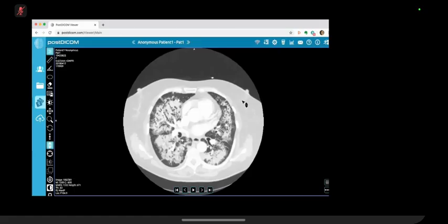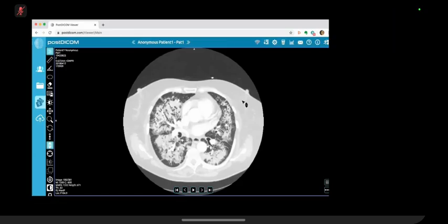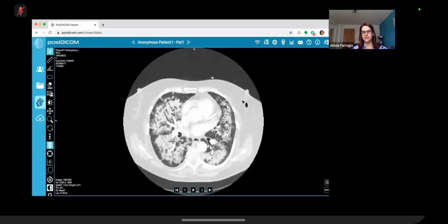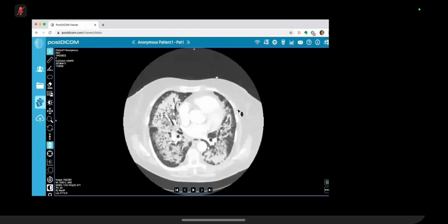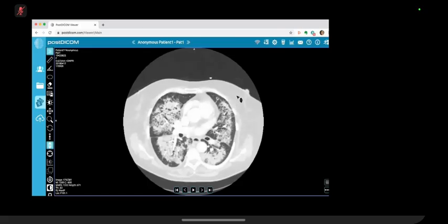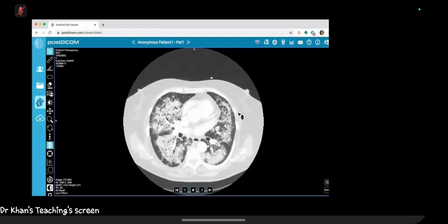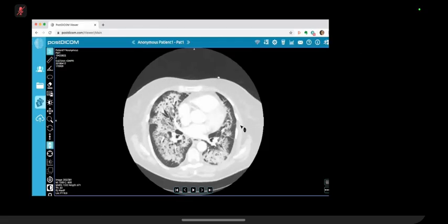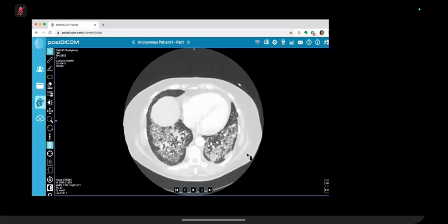Pulmonary alveolar proteinosis can sometimes give this appearance as well. It can spare the subpleural spaces. Yes, but usually it's diffusely homogeneous. I'm just wondering, pulmonary edema can, but again, it's quite atypical of pulmonary edema. And there are no effusions. Yeah, there's no effusion, and the heart size is normal for an elderly lady. It looks like a more consolidative picture to me.